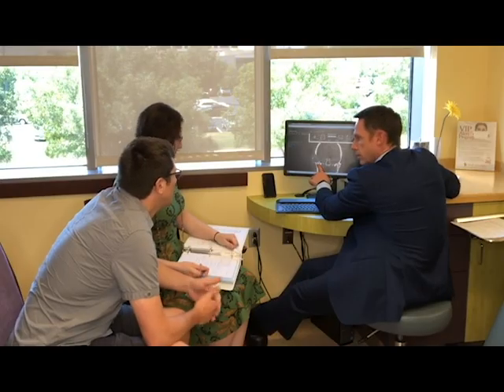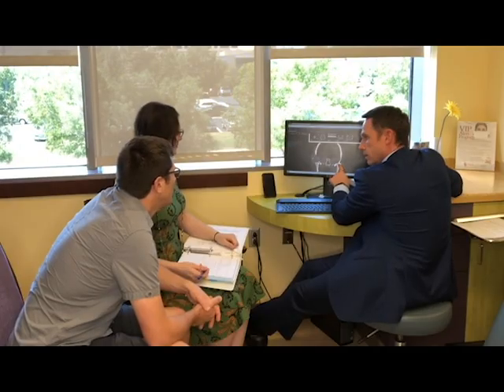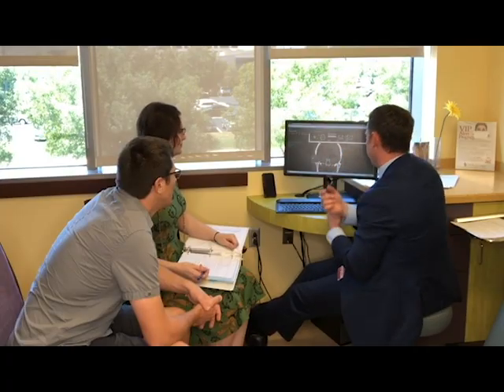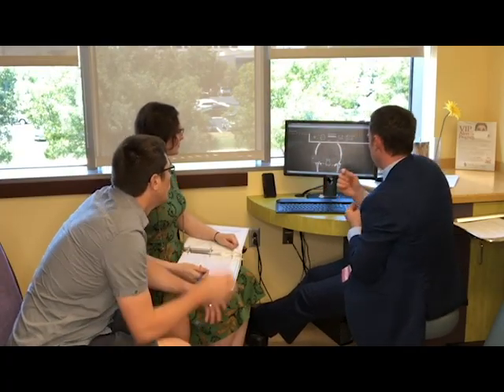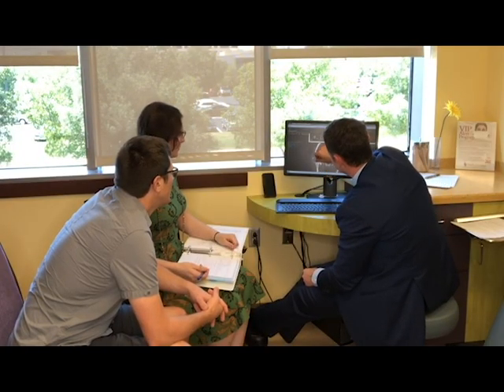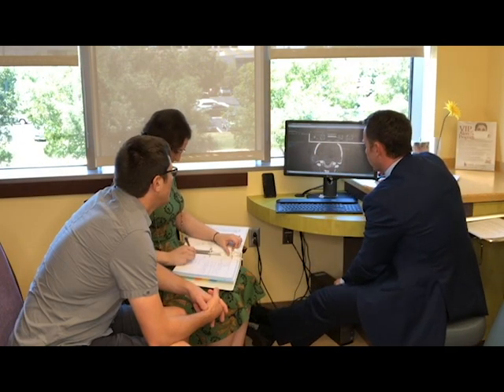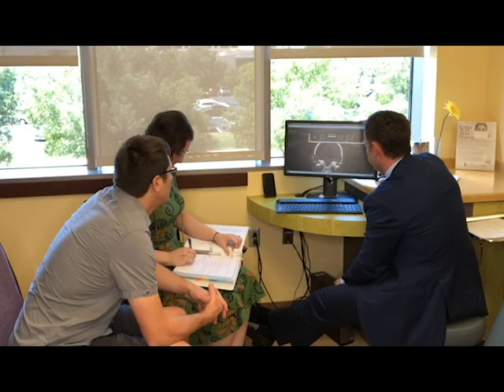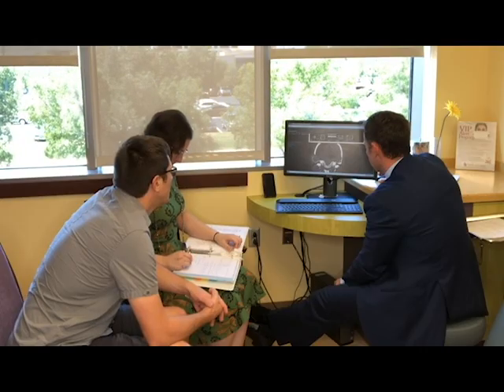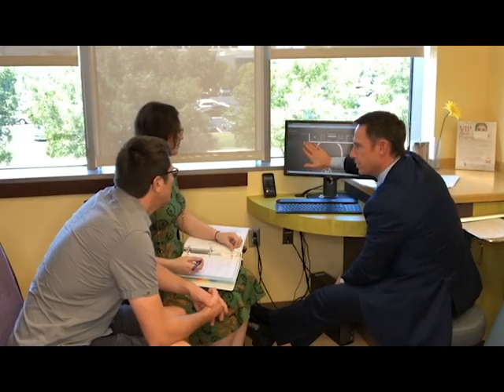That's what I just showed you in a different view. So here's that mandible. Here, as you can see, that's the normal joint. So you see how that bone is very white. It's very strong, and you're just seeing some of that joint being eroded there. Not the mandible itself, but the joint itself, the bottom of the temporal bone. As we go back here, I want to stop here for a second. Okay. Let's mentally Photoshop this out for a second, if you could.